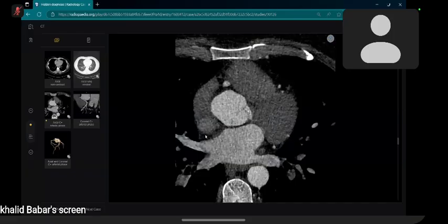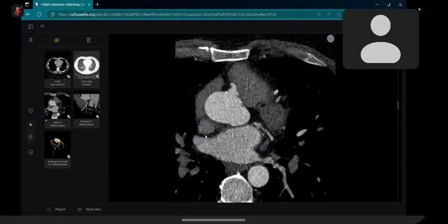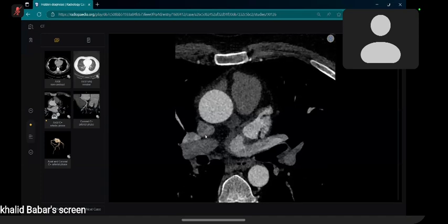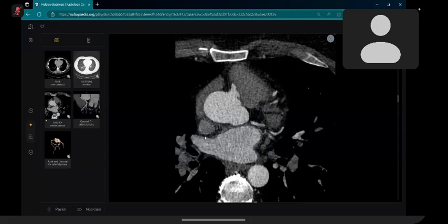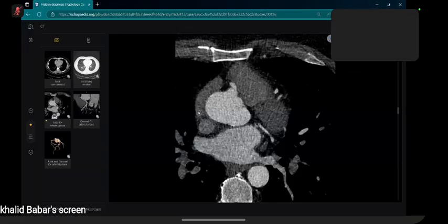The pulmonary veins are also unremarkable, and the bilateral lung fields in the confines of the mediastinal windows are unremarkable. I would like to review the lung windows as well, and I will correlate my findings with the presenting complaint of the patient, and convey them to the cardiologist for further work.